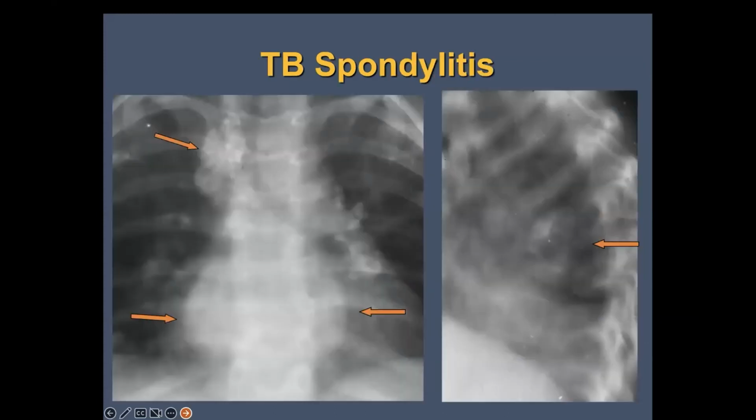And we don't see many cases that are this severe. This is a very old case, but you can see the prominent paraspinal collections, even on a chest radiograph. You can see the multiple calcified lymph nodes in the paratracheal and hilar regions in this child. And you can see that there's been profound destruction of the vertebral bodies that, as it heals, causes a very angular, permanent kyphotic deformity in these cases. So fortunately, these kinds of complications are really quite rare in the States, but can be very disfiguring and are much more common across the world.